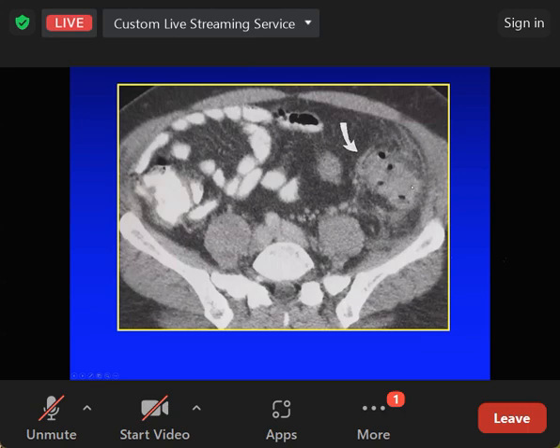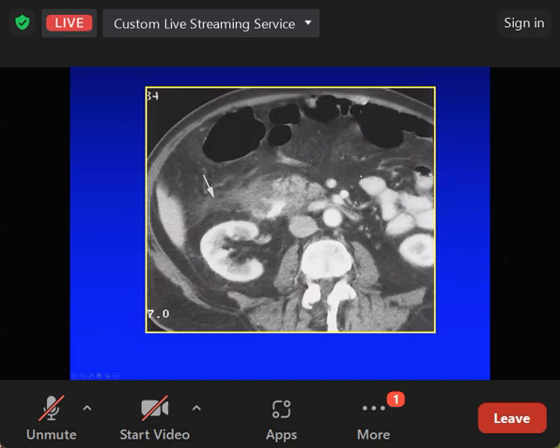Left iliac fossa pain, quite an easy one for radiologists. It's either a renal stone in an adult, or maybe a gynae problem, or diverticular disease with diverticulitis. And here is the descending colon. You've got your fat stranding, and this is acute diverticulitis.